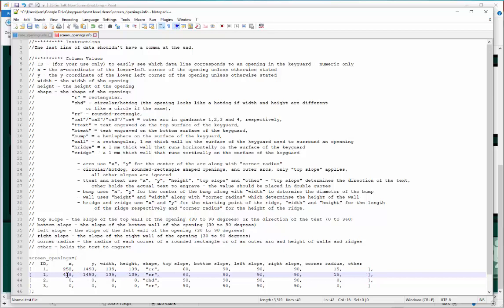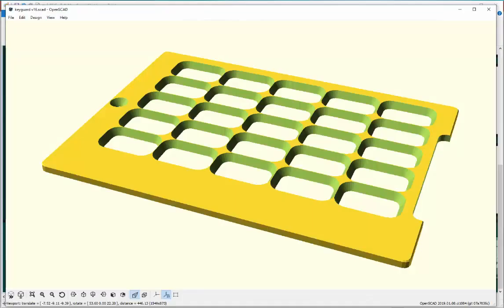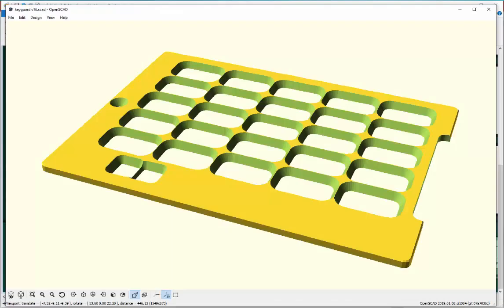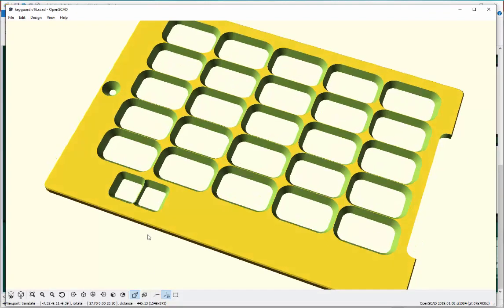But everything else is the same. So I only had to make that one change. And we'll go back and look real quick. Nothing here yet. Let's just go ahead now and save this file. Let's go back and look. Now we see our cuts, but we also see something that we probably don't want to go with.